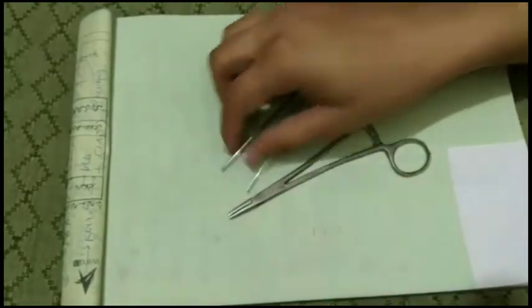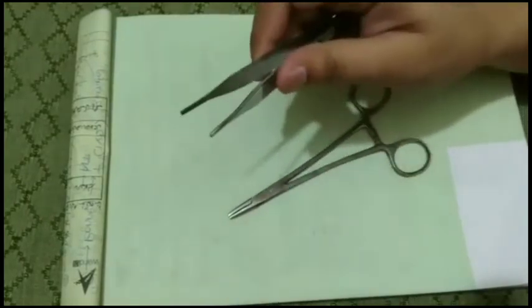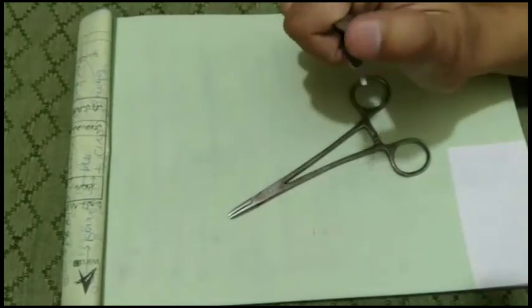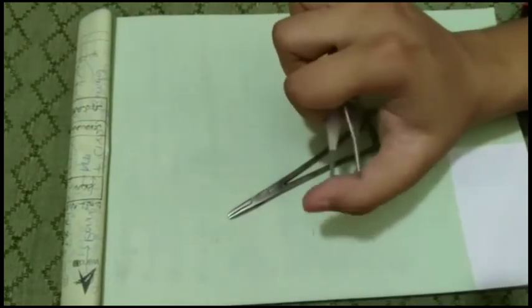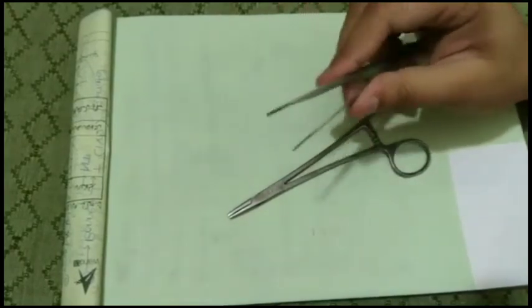Now, in the needle holder, this is the forceps. You can see the jaws have designs. Here it is serrated, which helps us in holding the organ. It doesn't have teeth. If it had teeth, it would help us in pulling tough organs, tough fascia. But this one doesn't have them, so it is a tissue preserving forceps, an atraumatic forceps.